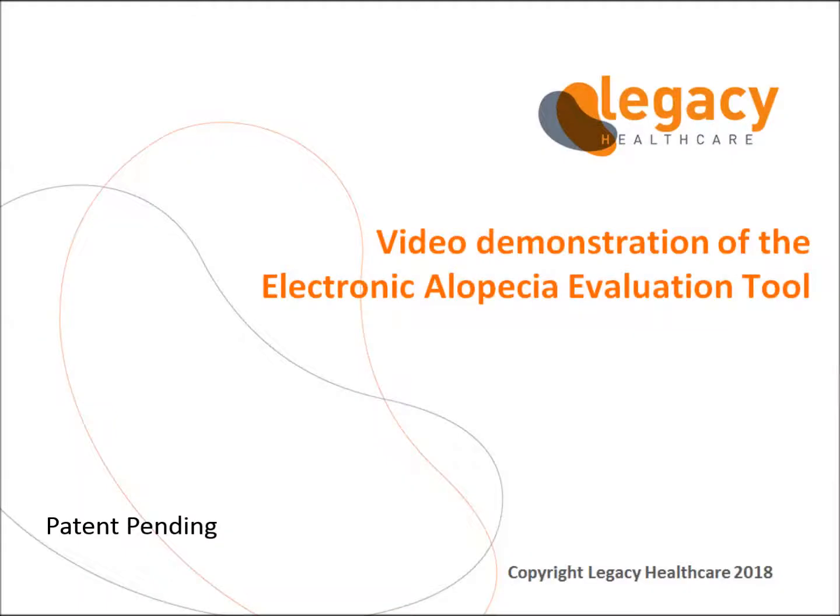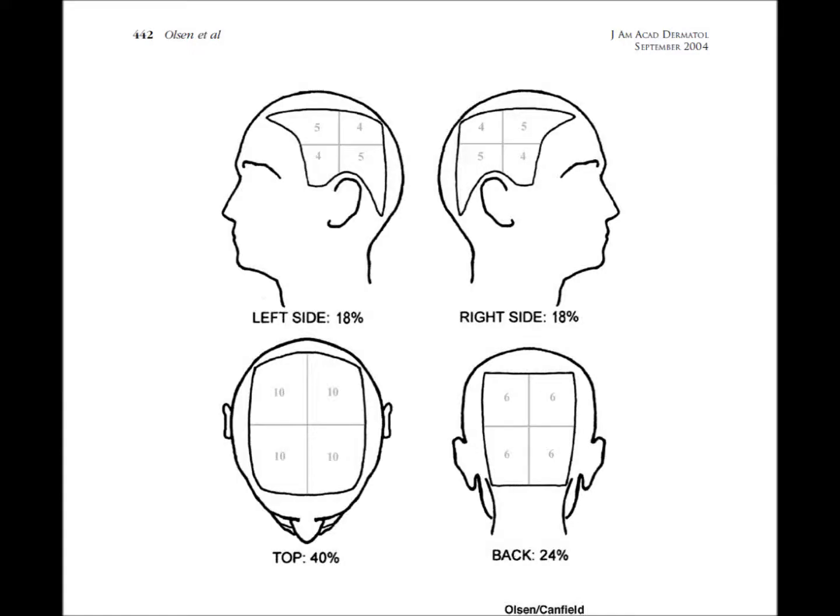Welcome to Legacy's Electronic Alopecia Evaluation Tool tutorial. This video aims to introduce you to our method and device for hair image analysis, and more specifically for assessing alopecia. We have based our method on the Severity of Alopecia Tool, SALT, developed by Olsen and Canfield, which has served as a guideline for alopecia research and for following progression of alopecia.